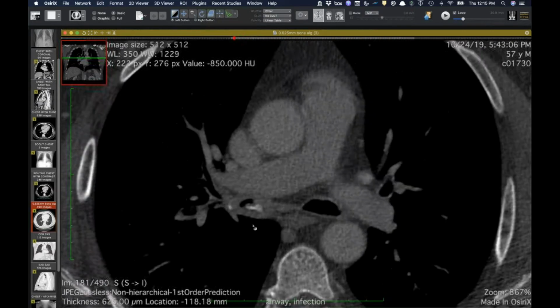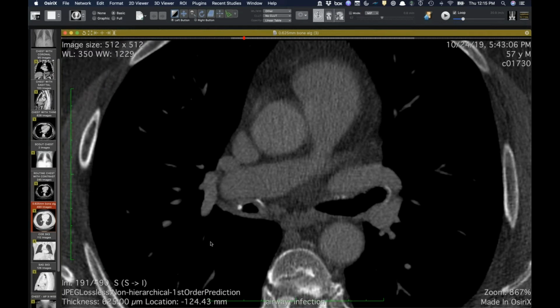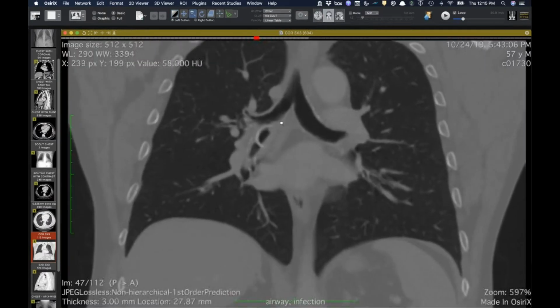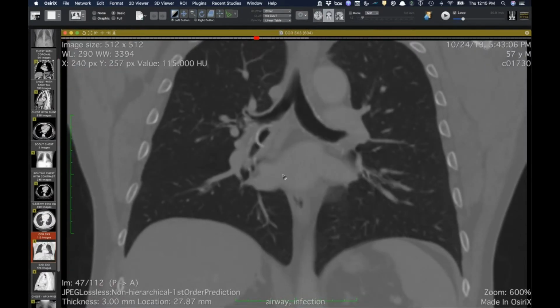Any guesses as to what this is? It looks like cartilage, like curved like a ring of a trachea or something. Yeah, it kind of does, right? But look at this. I mean, here it looks almost like a suture needle. Yeah. Wow. Oh, it's that big. It's that big. Yeah.